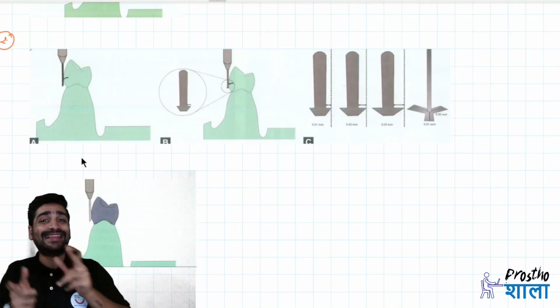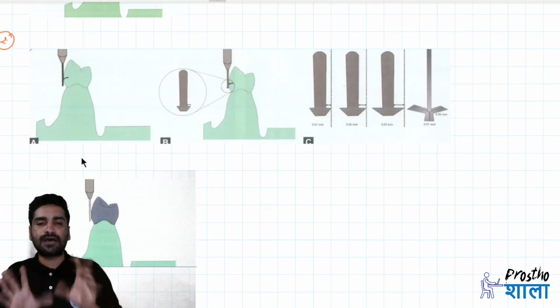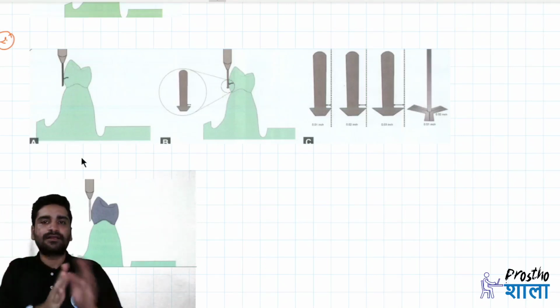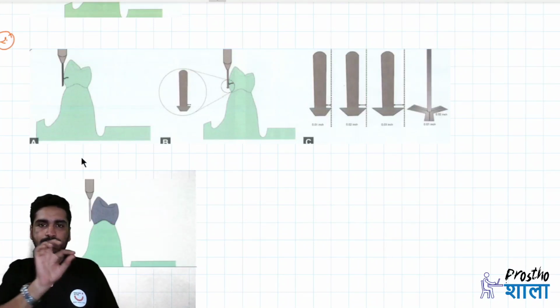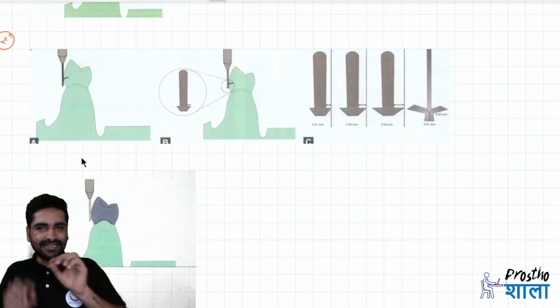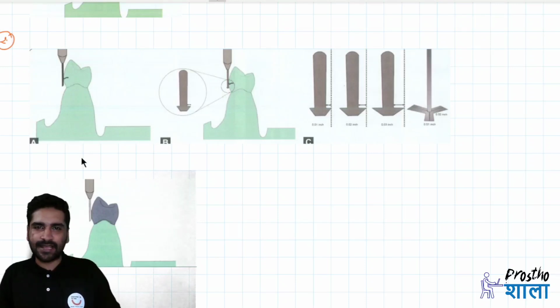To bring that picture on the cast, you have a structure similar to the analyzing rod, that is your carbon marker. You have used a pencil, right? Normal carbon pencil. If you remove all the wood around that pencil, what do you see? A thin lead of carbon, cylindrical, right? Similarly, like the analyzing rod, you have a thin cylindrical lead of carbon which gets fit into the surveying arm.